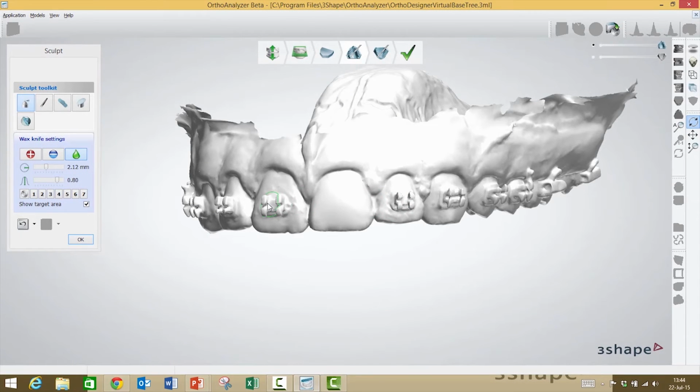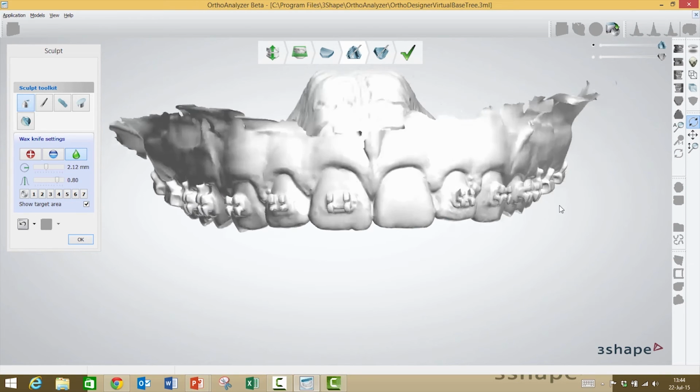Yeah. As we said before, by debonding this, you can debond all the brackets on the patient here, and so you can print out the model set, make a retainer for the patient to give the patient for the last visit. When you're debonding all the brackets, you have a retainer to give them at the same time.